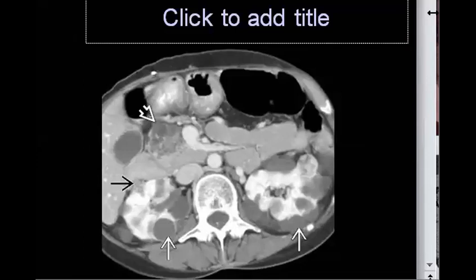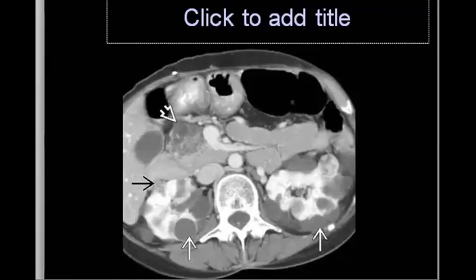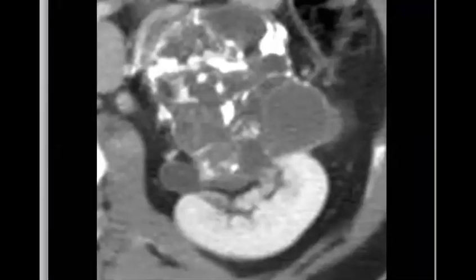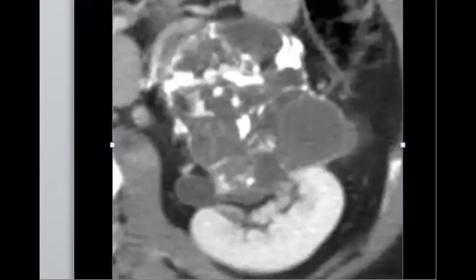Okay. So again, when you find a lesion, what are you talking about? Yes, talking about a cystic mass lesion which has calcification. So what is your differential diagnosis?